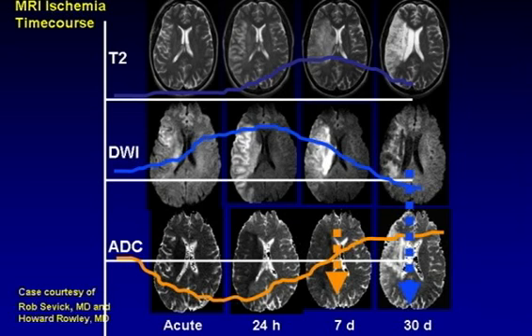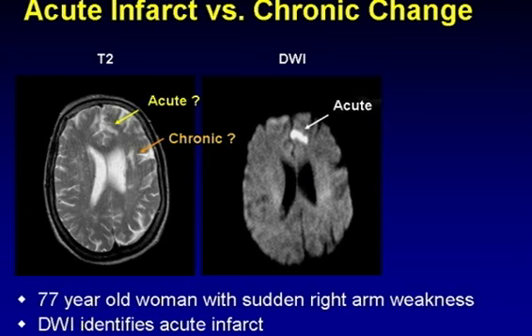So when you look at the DWI and the ADC, you will see some increase in signal in these areas, and this is really because the DWI has a very long TR and a very long TE, so essentially it has very heavy T2 weighting, so you'll have some element of T2 signal abnormality seen as T2 shine through. Okay, so how is it useful then?